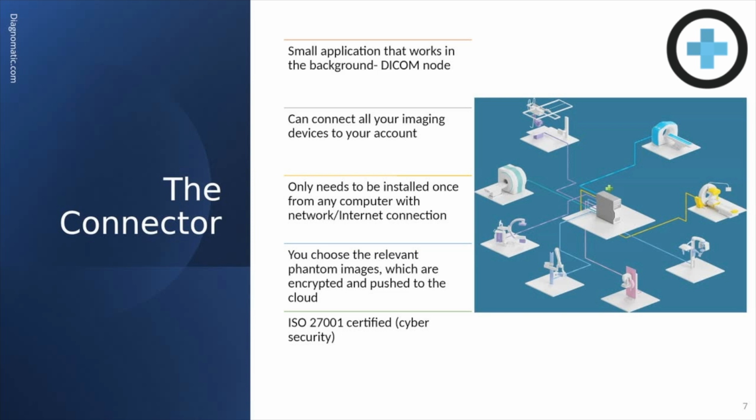Briefly on the connector that I mentioned, this is, as you can see here, basically a small application that works in the background. It links all your different imaging devices. So your X-ray machine, your MRI machine, your CT machine. You can have all your images and do all your QA for all your different modalities and have all of that imaging stored in a single repository. Nice thing about the connector is it only needs to be installed once within a network, and then once that's the case, all your different devices that are part of that network will allow you to send images to that cloud-based system.